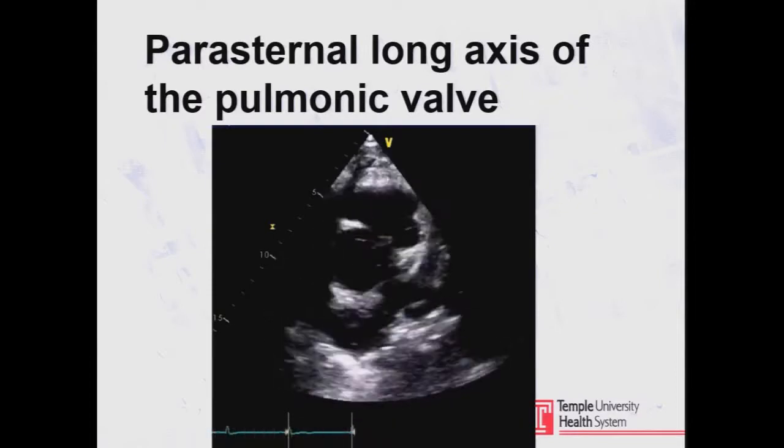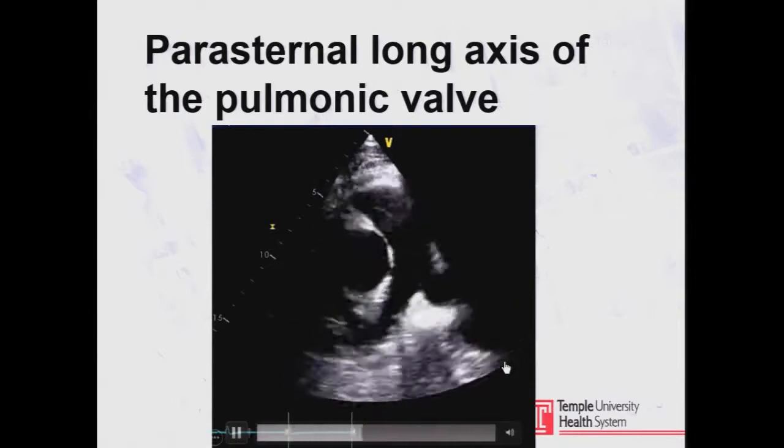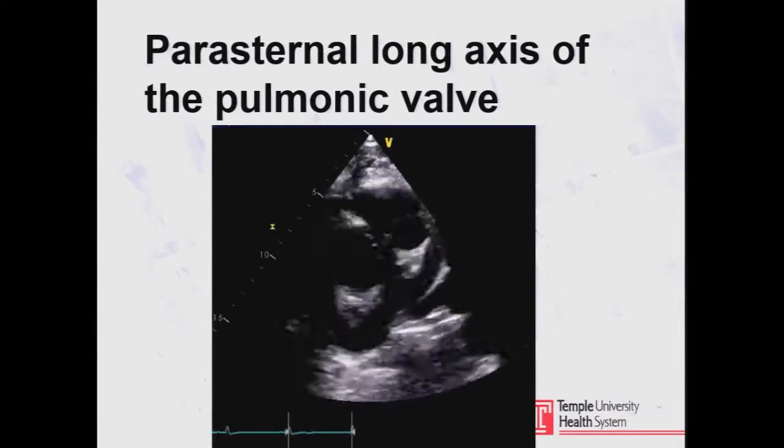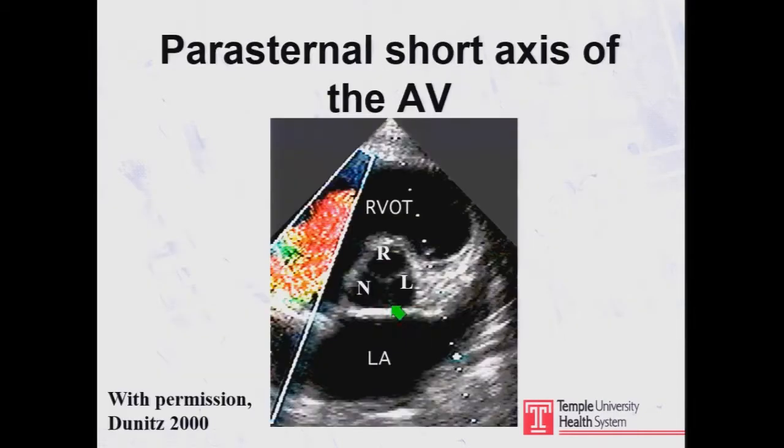And so you can have your textbook present views to you where you believe you're looking at the pulmonary artery and it's really the left atrial appendage. Here's an example from one of the ASE publications. And again, the left atrial appendage and its relationship with the pulmonary artery.